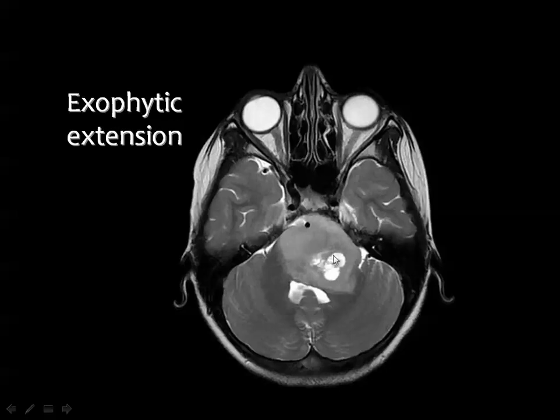And you expect from a brainstem lesion to compress the basilar artery, displacing it anteriorly against the dorsum sellae. And this does not occur in cases of brainstem glioma because of this particular character of this tumor, where it can grow exophytically anterior to the basilar artery, displacing the artery more posteriorly.